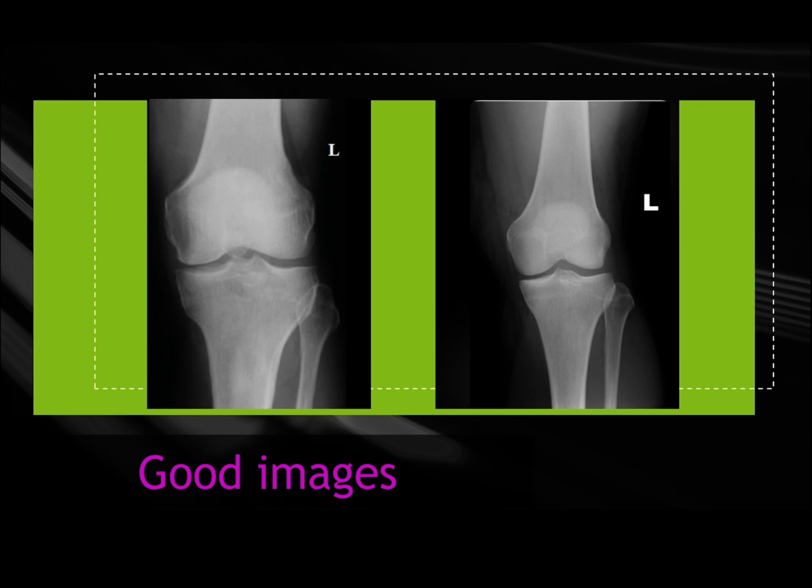So here are our good images. They're right there in the center. The patella is right there. The second image probably could have been collimated in a little tighter, but it's still overall a good image.